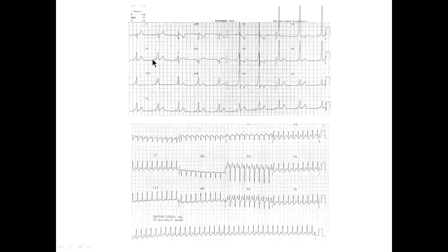This is a patient. As you can see, you have the P and then the delta wave and the QRS. So this is a patient that we know has WPW. It's very nice here. See, short, the P and then hardly any PR interval and the delta wave. So if you were in the ER and a patient came with this, it is actually a supraventricular tachycardia, right? Its QRS is thin and it's going like crazy.